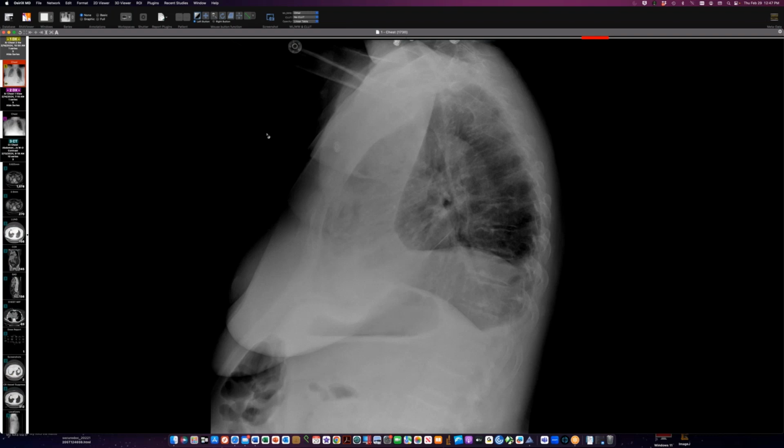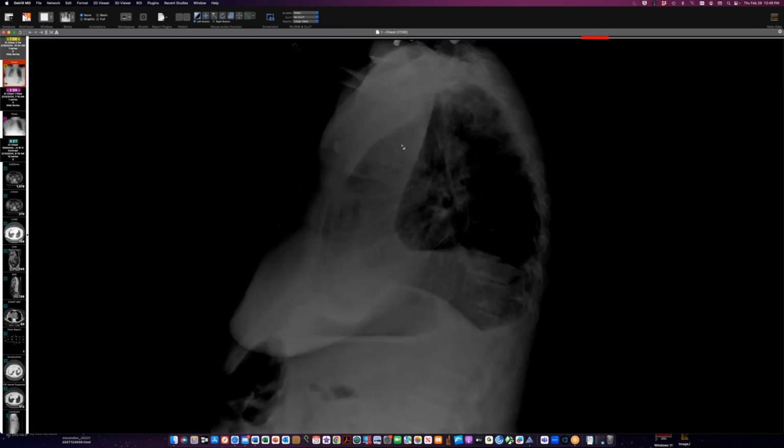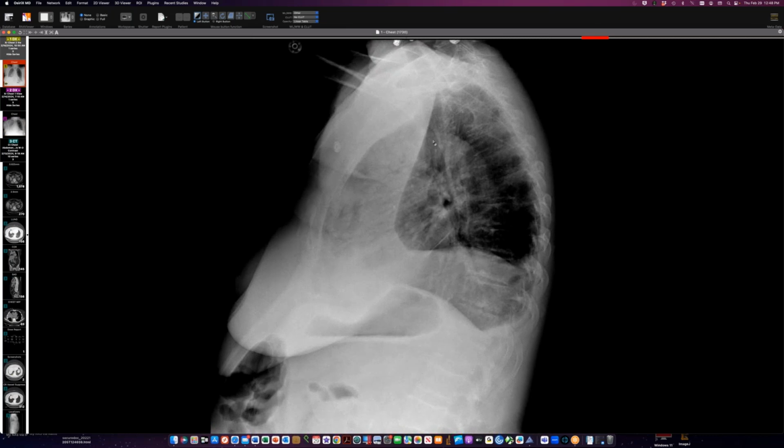So this was actually much worse consolidation. It looks better on frontal radiograph, but it is actually much worse consolidation. It's now the entire upper lobe and middle lobe. We do have pleural effusion posterior on both sides. So, gosh, radiographs are just trying to deceive me all the time. So worsening consolidation looking like improvement.